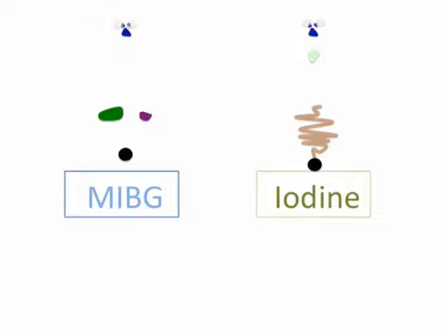Now there is a trick, which is in a post-iodine 131 ablation situation where you're getting treated, you can have liver uptake, and I'll show you a case of that. So then you may say, well, if you've got liver uptake, then how the hell do you distinguish between these two? You look at the bowel. And the way that I remember that is, if you're trying to trick me with this iodine thing, then you must be full of shit. So this one's full of shit, this one's not. Bowel uptake is a difference.